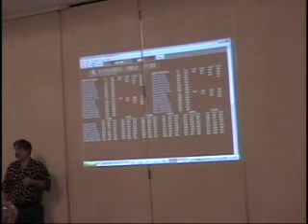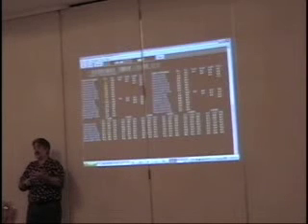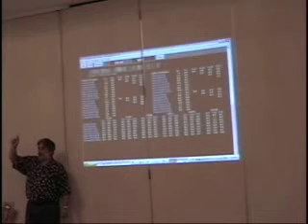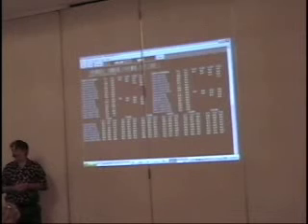Oh yeah. The protocol design includes everything. As you saw when we loaded it, it said 2 channels, C3, C4. So all we had to do was say no, it's 4 channels, F3, F4, P3, P4, and we're done. Everything else is done at the lower level of the Z-score software.